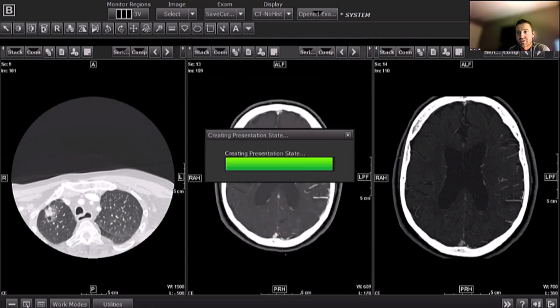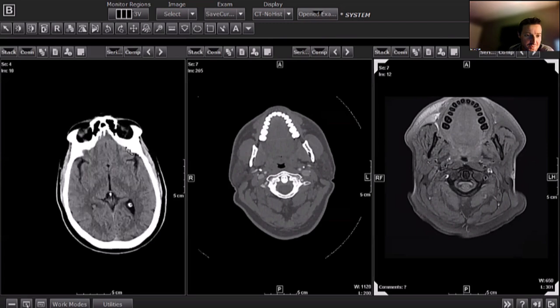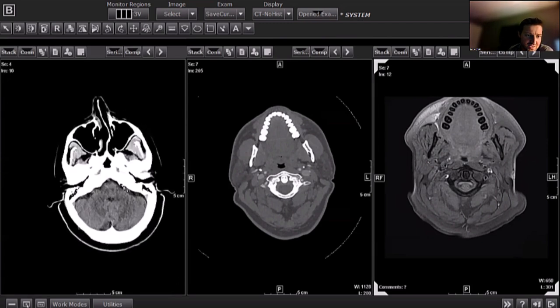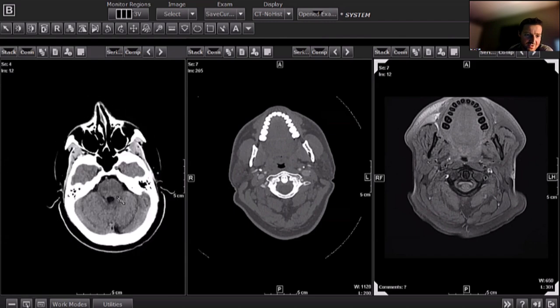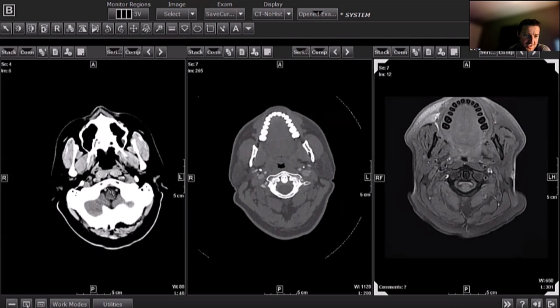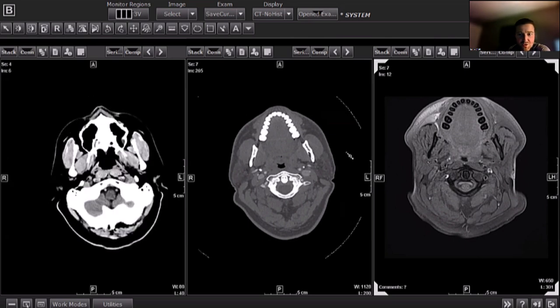Okay, we're starting to get to some slightly different cases. So this was a younger patient that presented with vertigo and pain in their neck. You can see on the unenhanced CT head, they do not have any definite ischemic changes. We're obviously thinking posterior circulation. There is a slightly hyperdense, questionable right V4 segment.